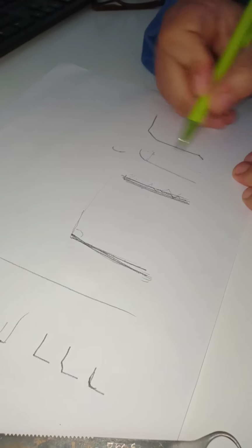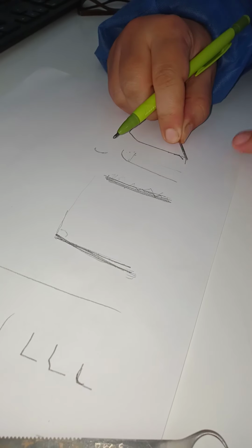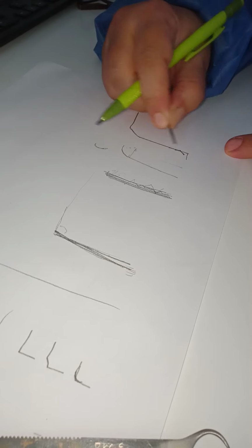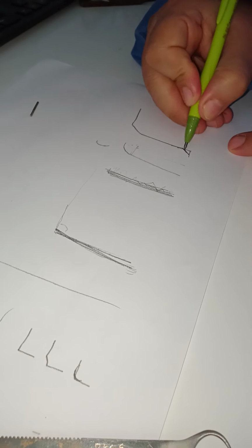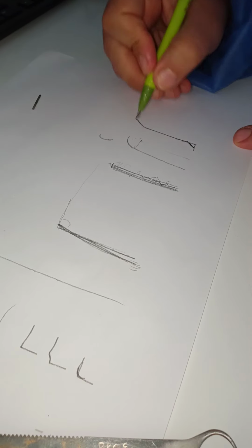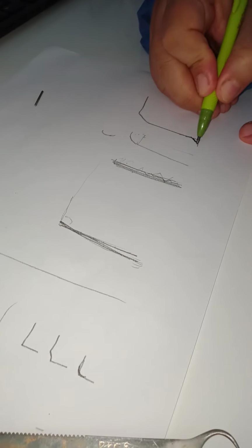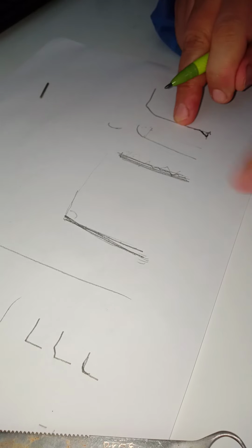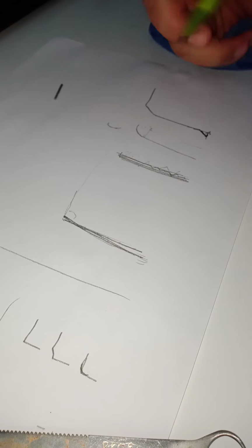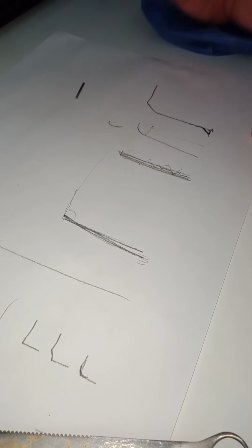And simply, once you finish the sharp angle here, you just slope with the bevel and create a very small bevel at the end. This also removes the overhanging enamel prisms. If this is 90 degrees, it removes the overhanging enamel and also creates a ledge. This ledge will help overcome any shrinkage, it will keep the gingival seal of the crown, even if some shrinkage happens in the crown material during sintering or during firing.